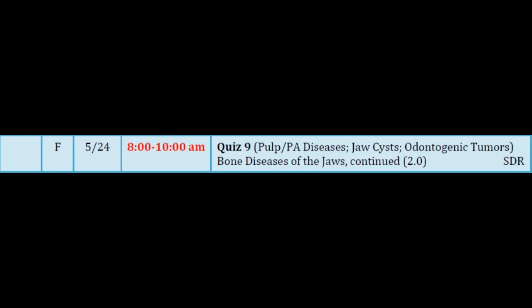This was a patient who complained of tooth mobility and had some soft tissue changes around the teeth that were mobile and vague, ill-defined lucency. And that one ended up being adenosquamous carcinoma from the lung. Can you tell by looking at it came from the lung? No. Is it a surprise? No. That's one of the ones that can go there.